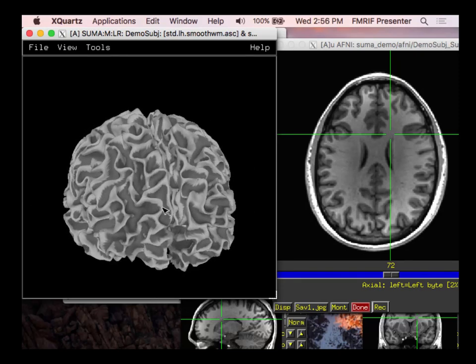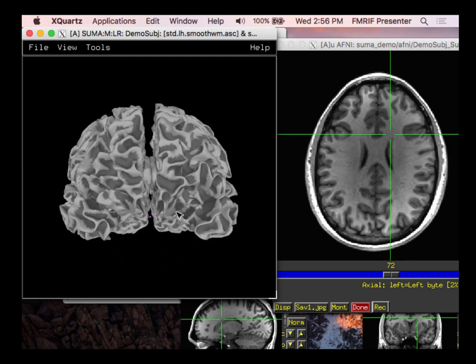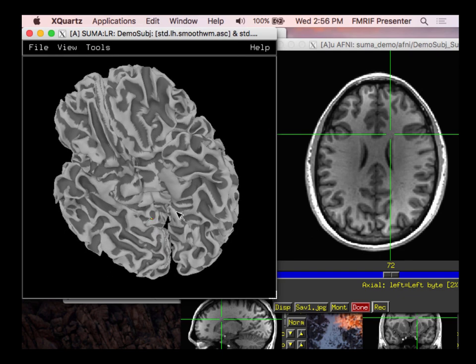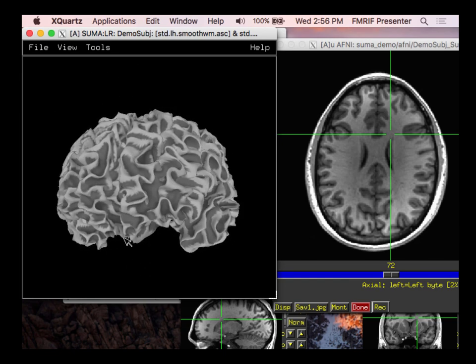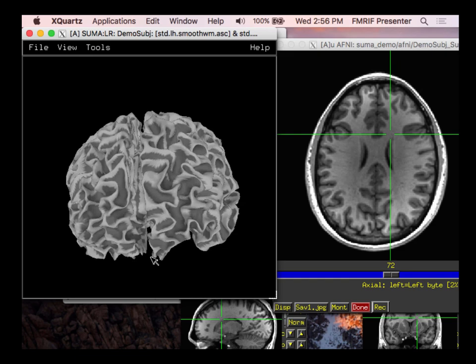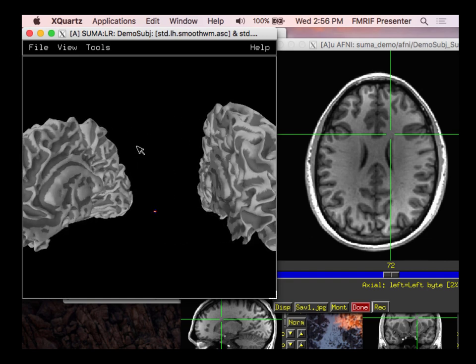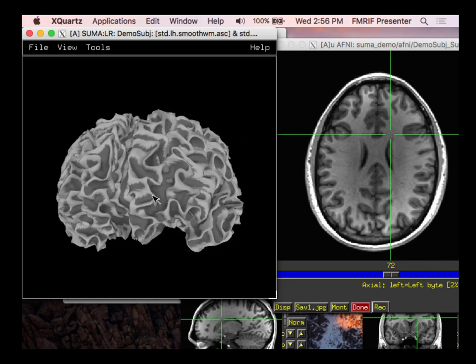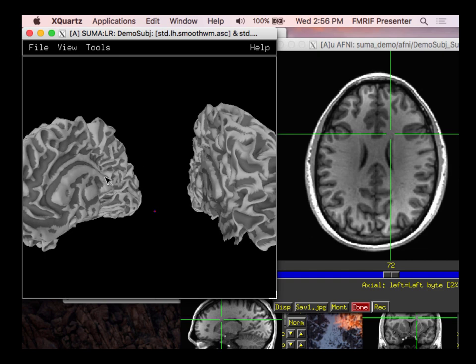And if you want to, you can see the sulcal and gyral patterns and things like that. And if you want to make a nice screensaver, you can also do things like that. But this again is really useful. You can see these things. One problem might be that it's a little bit hard to see inside at the medial regions, but one way around that is we can open it up and take a look at what's inside, and close it back up. Maybe. Oh, it's hard. Okay.